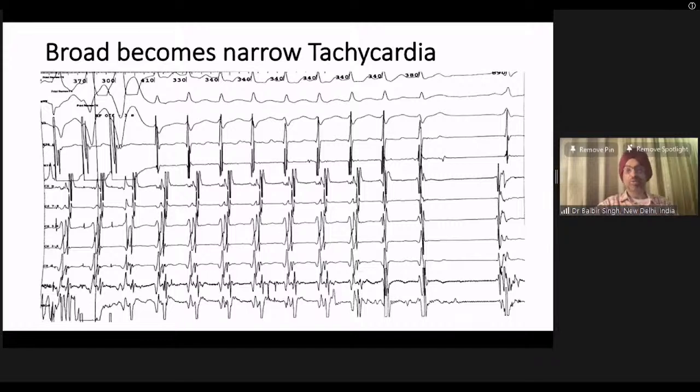We will now show you the intracardiac electrograms. The CS electrograms are there. His are there now. This is the ventricular pacing. So from ventricular pacing, we convert an antidromic tachycardia into an orthodromic tachycardia. How is it possible that by pacing the right ventricle we get this kind of complex? The answer is simple: when you pace the RV, there is a delay from RV going to the LV. This is a left lateral pathway.